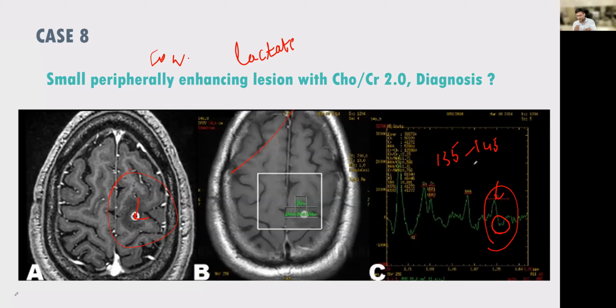But when there is a lesion of CSF signal intensity suppressing on the FLAIR, then most probably you are dealing with an NCC. Even with so many differentiating points, sometimes you end up stuck between NCC and tuberculoma. In case of too much ambiguity, call those things tuberculomas, because NCC resolves even without treatment, but tuberculosis worsens and there will be endarteritis and it can be devastating. If you put in diligent effort and hard work trying to differentiate NCC versus tuberculosis and still have a doubt, call those lesions tuberculomas so that they go for ATT.